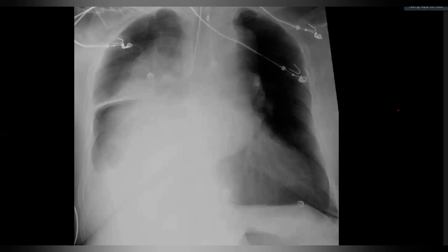So I'm thinking of some pleural effusion with some underlying consolidation, but the shape of the opacity is more centrally placed and convex. Okay. So it can be some hematoma or hemorrhage. Do you want to ask me any questions?